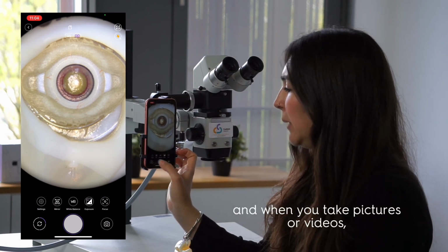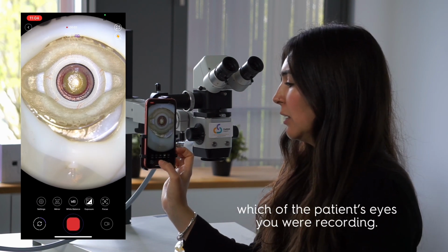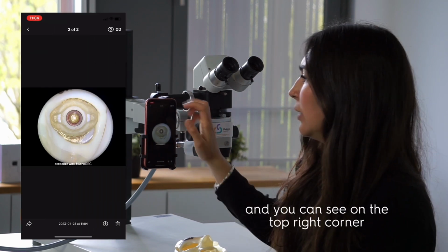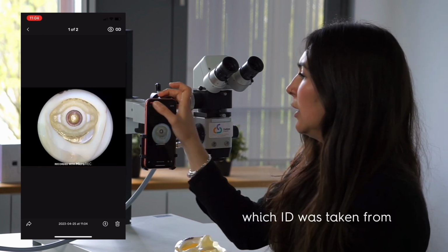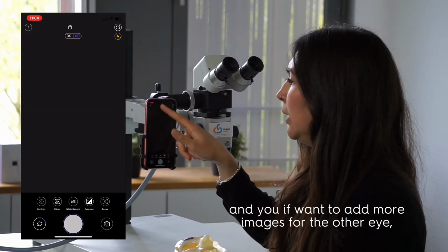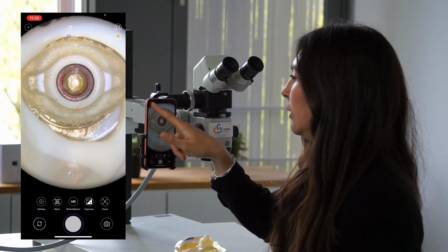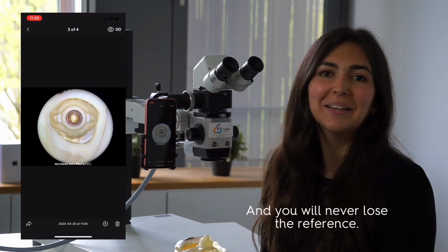And when you take pictures or videos, you can always know which of the patient's eyes you were recording. So you can go back here and you can see on the top right corner which eye it was taken from. And if you want to add more images for the other eye, you can also do that. And you will never lose the reference.